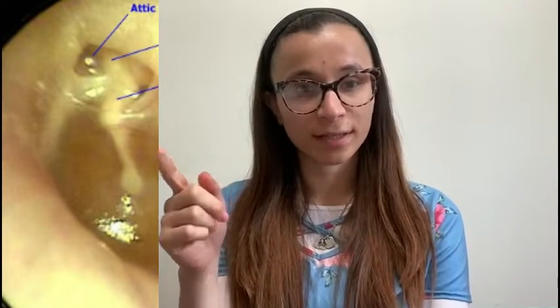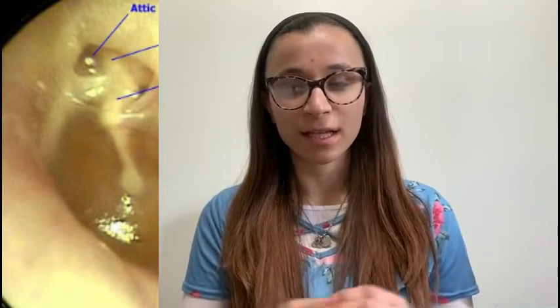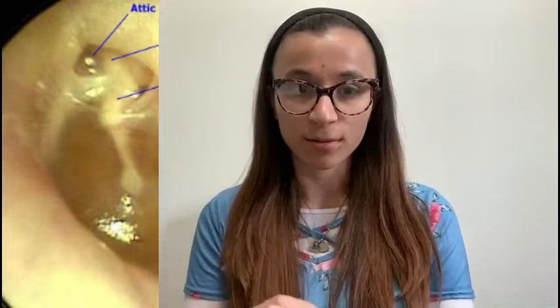Now let's go on to other ear abnormalities that you should also look out for. So cholesteatoma, you can see retracted, the margin will look clear, the drum will look sunken, but the main thing with cholesteatoma that's going to stick out to you is an ugly, crusty, yellow thing, usually in the attic region. So it's important to know your attic region. If you look at this picture over here, you'll see a little attic region. And that attic region is usually always serious stuff. So if you see something there, it's always serious. So basically, if you see a yellow crusty thing there, it's cholesteatoma.